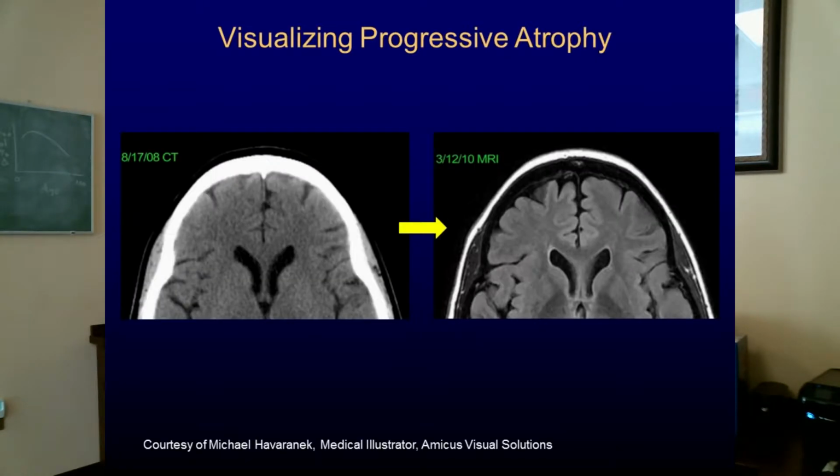When you look at these before and after pictures, although the resolutions and the lighting are a little bit different because one is CT and one is MRI, two different technologies, you can still see the main brain structures. And the question is, do you see any change looking from left to right? And you may or may not. If you look really hard, you might see it. It's subtle. It's hard to see.